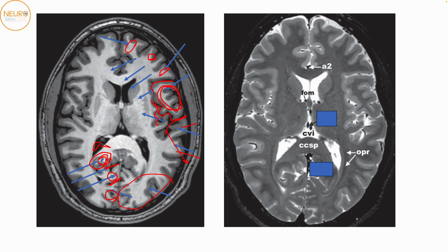You'll have the cingulate isthmus, and you'll have the lingual gyrus located over here. So we've picked up on the atrium. There's the choroid plexus of the atrium. This is the splenium over here. This is the third ventricle. These structures that we can see running within the third ventricle are the internal cerebral veins over here.